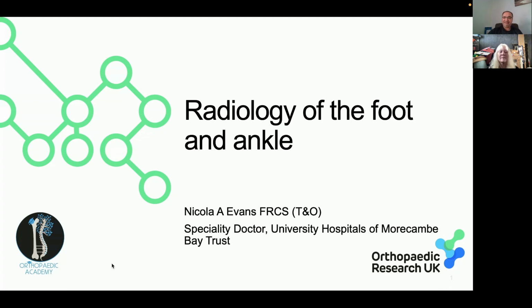Over to you, Nikki. Okay, thanks very much, Firas, and welcome everyone. So what I'm going to do is just go through the radiology of the foot and ankle and maybe some common conditions, so you know what to look for when you're looking at x-rays of this part of the body.